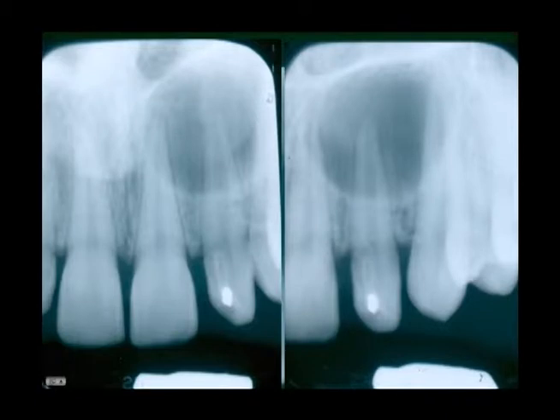This became chronic and has now formed a radicular cyst, which is one of the more common dental cysts to be observed. A number of problems can arise relative to differential diagnosis of the radiolucency or the radiopacity of rarefying osteitis and sclerosing osteitis.